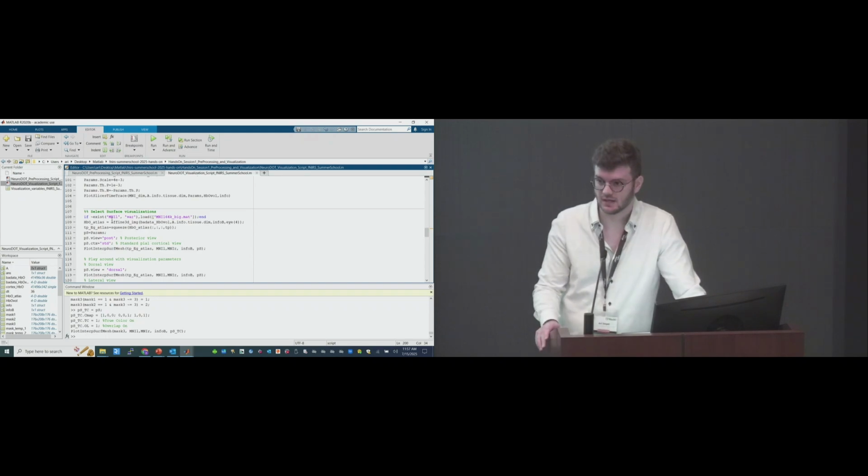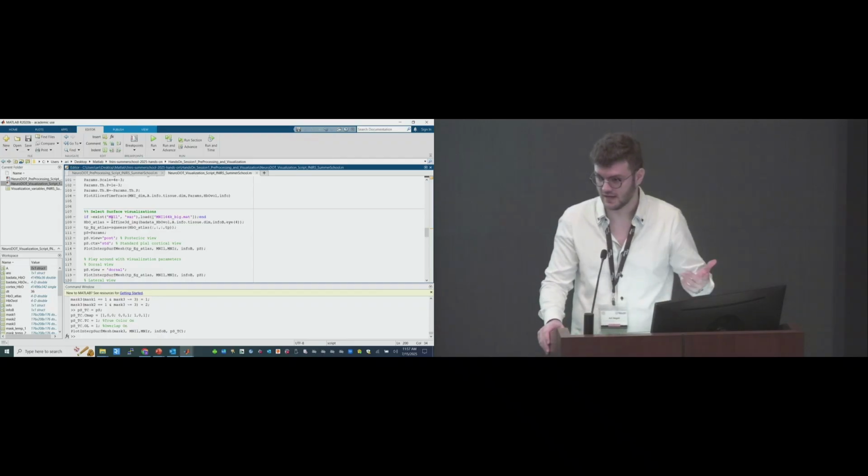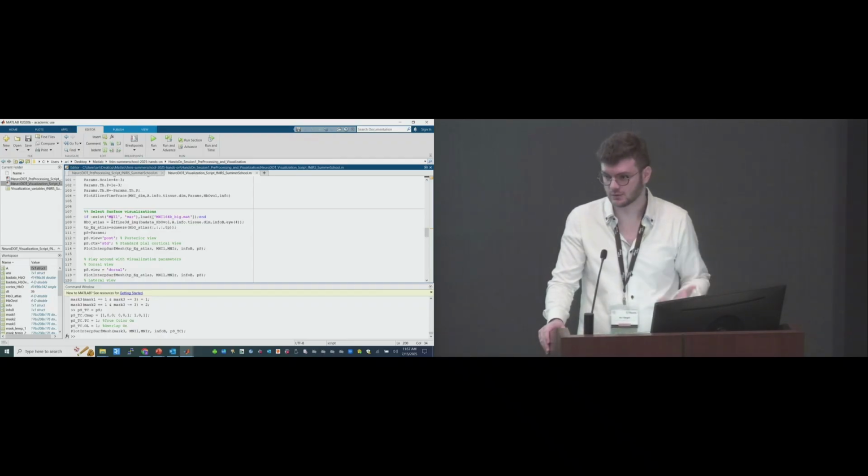The toolbox contains several commonly used atlases, both in volumetric and mesh form, to plot your data on. Granted, if you have a mesh or a volume for your subject, you can load that as well. But the toolbox does contain atlases in both volumetric and surface-based form for you to plot stuff on.